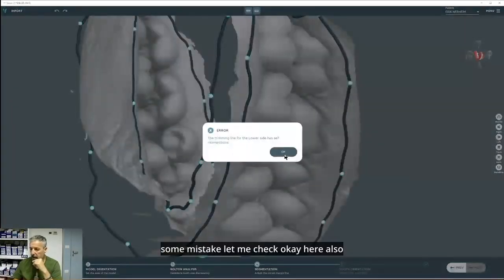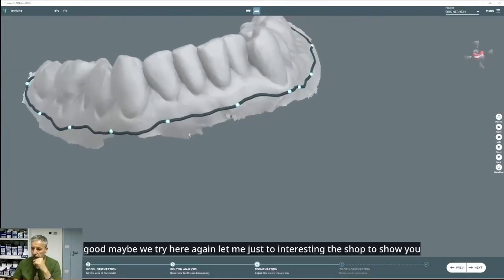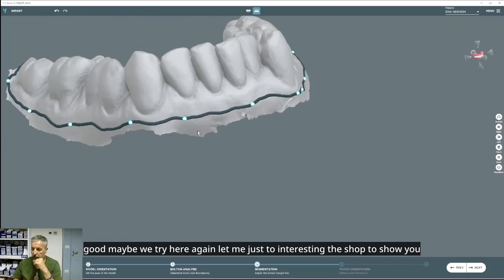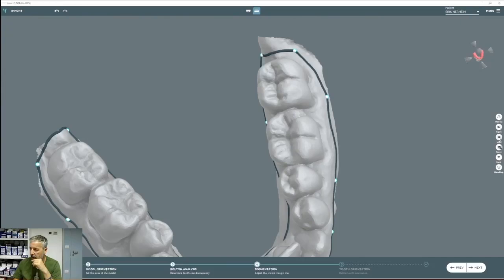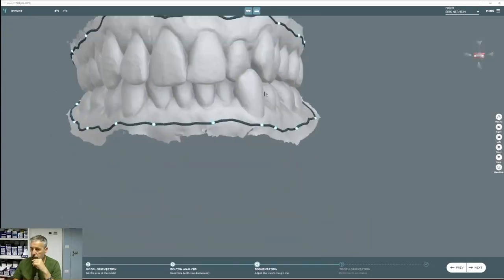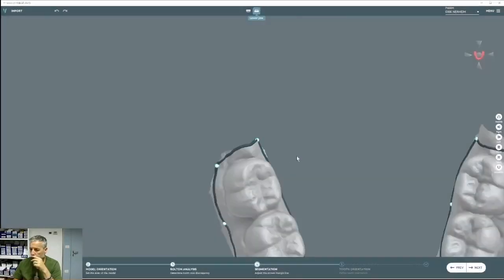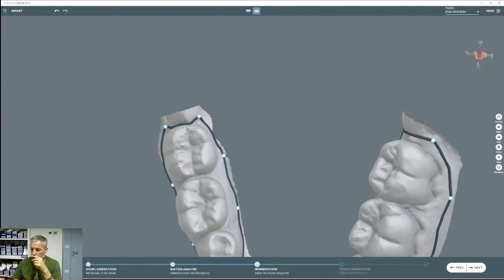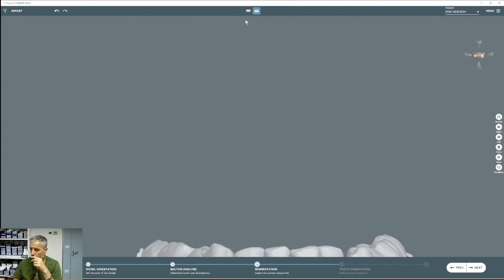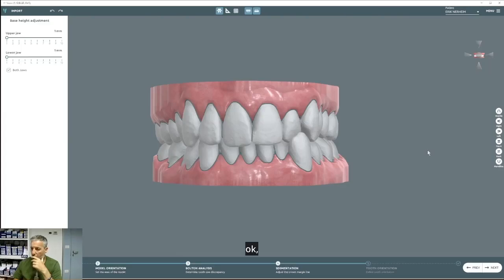Some mistake, let me check. Okay, here also. Good, maybe we try here again. Let me just do this to show you some mistake. Okay, see, try again. Okay, this one. Okay.